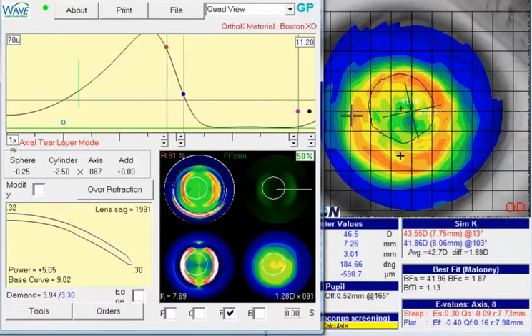Looking at the waviness in the posterior topography, this could also be an issue with reduced tear film. So I would probably also recommend that this patient do the non-preserved artificial tears a few times during the day. I would have patients do Soluvisc or liquid gel during the day, 3 to 4 times. And then maybe even consider adding some Refresh Plus or other non-preserved artificial tear or saline inside the lens when it's time to wear the lens, and see if we can smooth out the appearance.